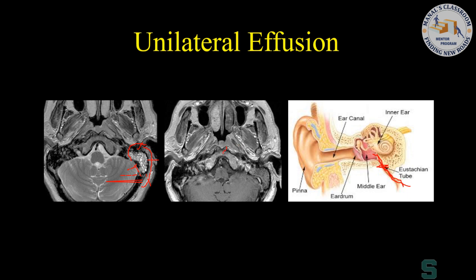And in adults, the most common thing is going to be a very, very subtle nasopharyngeal carcinoma that's located in this fossa. And what's the name of the fossa here? Starts with an R. Rosenmuller, exactly right. So the earliest locations of nasopharyngeal carcinoma to form are in the fossa of Rosenmuller. So once you have this tumor arising from the fossa of Rosenmuller, it's going to push this structure. What's the name of this structure here? It starts with a T. The torus tubarius. It's going to push the torus tubarius anteriorly.